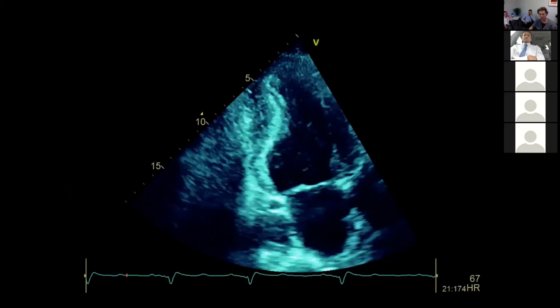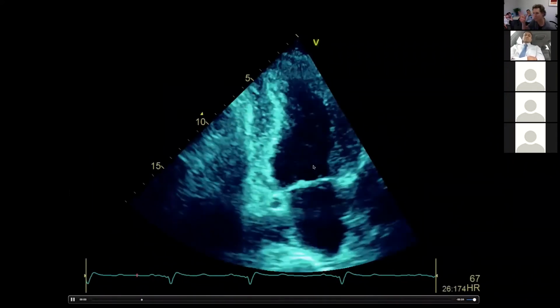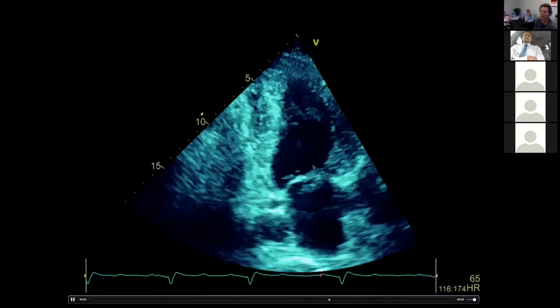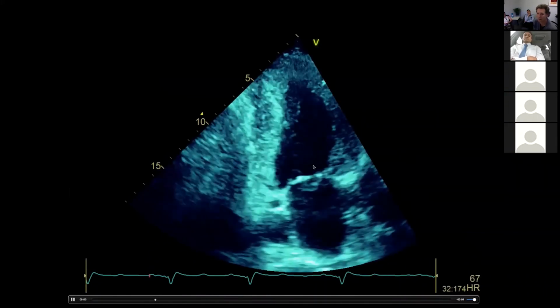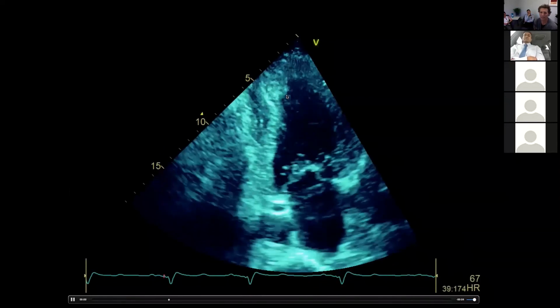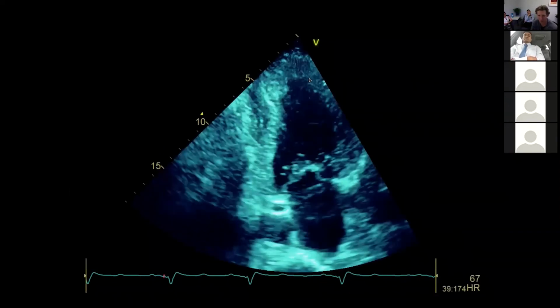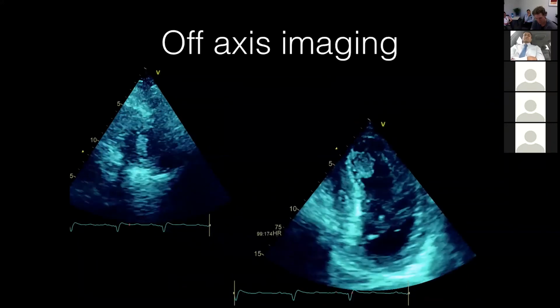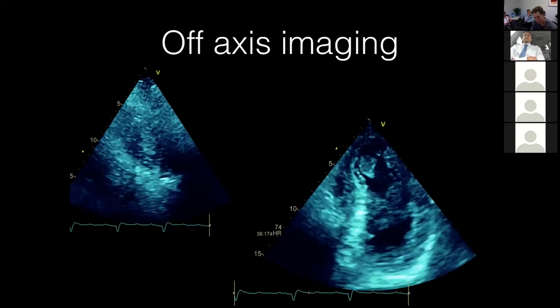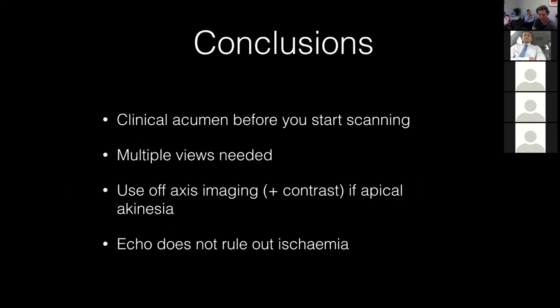If I just go back to the two-chamber here. So here on the two-chamber, a couple of things. Can you see the SEC, the smoke that's coming through the top of the LV, obviously indicating sluggish blood flow, and just coming in every now and again, there's this. This appears hyperechoic. Got it. You got it. Yeah, 1 by 1 centimeter, more likely consistent with an apical thrombus. Very nice indeed. So don't forget about that off-axis imaging.